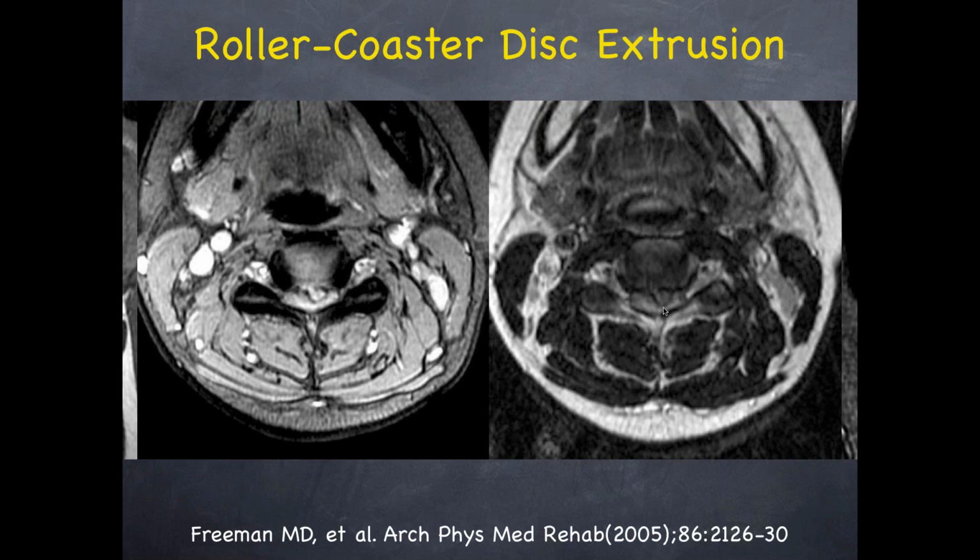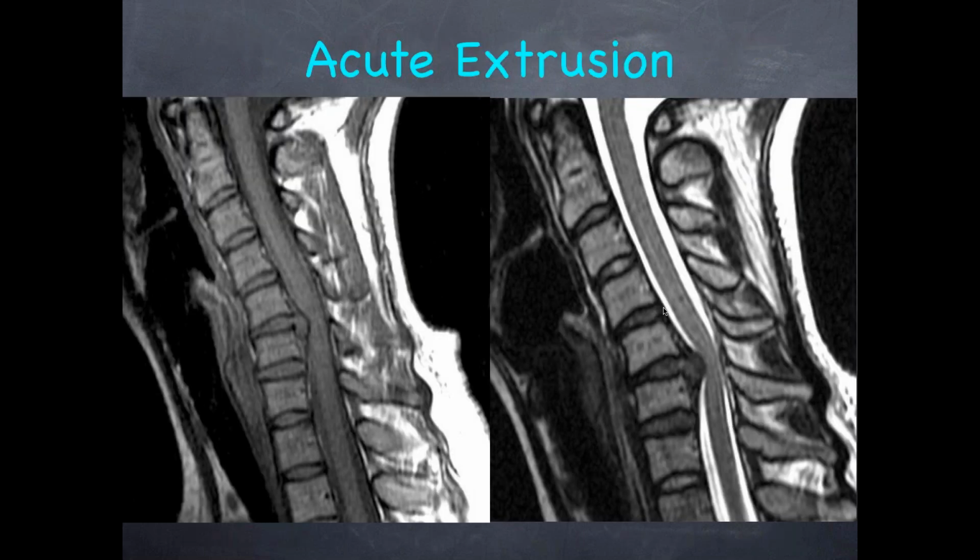The patient was completely asymptomatic before the roller coaster and had really pretty profound neurologic symptoms that happened immediately getting off the roller coaster. So be careful when you go to Magic Mountain. Yeah. And here's another acute extrusion.